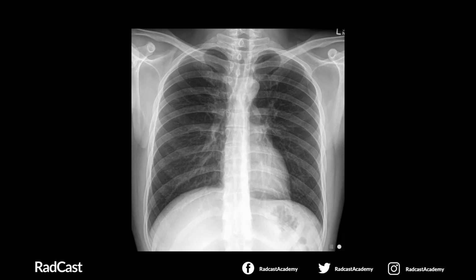Now let's have a look again at our normal chest X-ray to further assess circulation. Let's start off with the heart size and position. We can see here that the total cardiac width is no more than 50% of the total thoracic width. Additionally, about 2/3 of the heart is towards the left-hand side, with about 1/3 of the heart on the right. Next, the heart borders. They should be very well traceable and defined, as they are here in this case, and there is no clear lack of borders. We can therefore be confident that this represents a normal circulation in a chest X-ray.